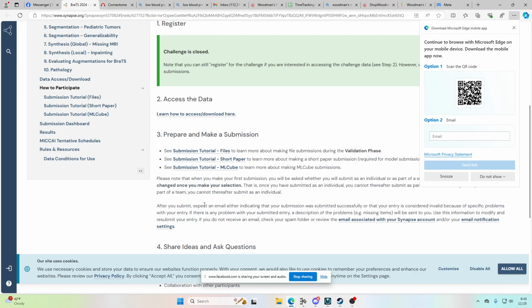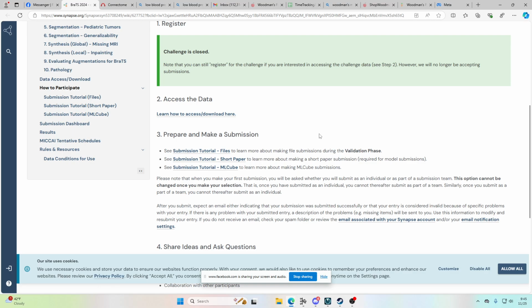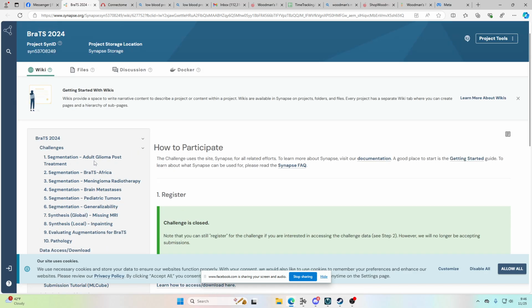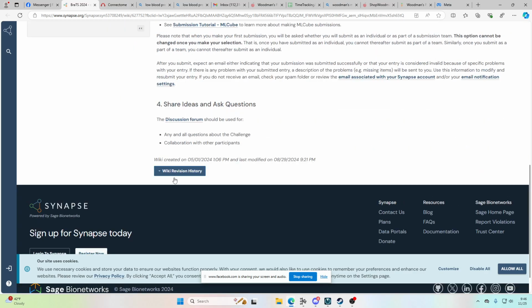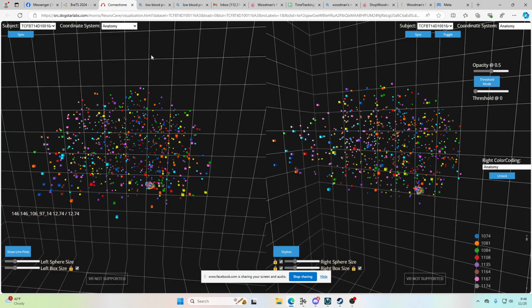So basically, they had some professional radiologists look at the MRIs and circle the tumors, and then they had a bunch of coders write AI code to do that, and then they compared the AI results to the gold standard. So that's the data set there.